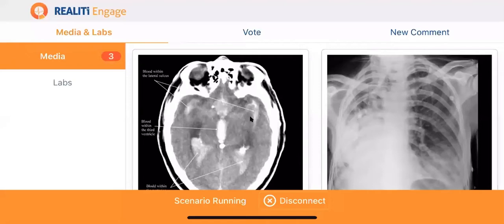That's going to log based on the name that you put into the app when you began and show that that individual's name gave a thumbs up or a thumbs down as far as what you see for the debrief. So once the debrief is finished, I'll go back to the controller now and show you what that looks like, and then we'll talk a little bit about the training management system.